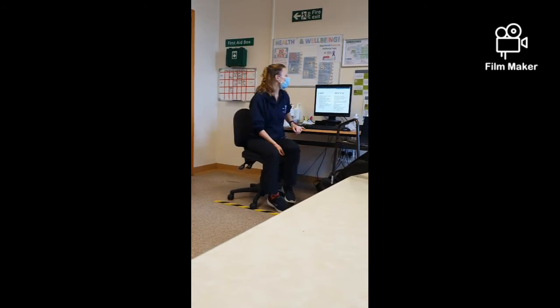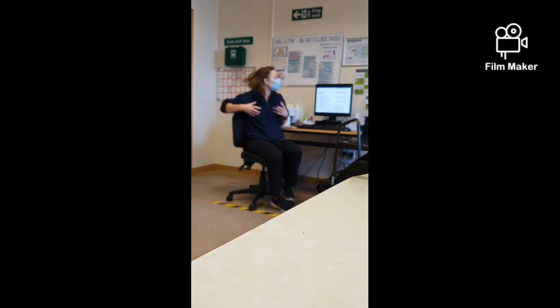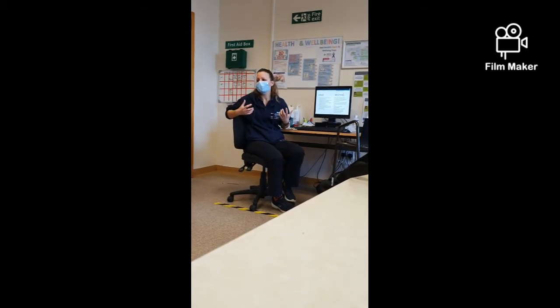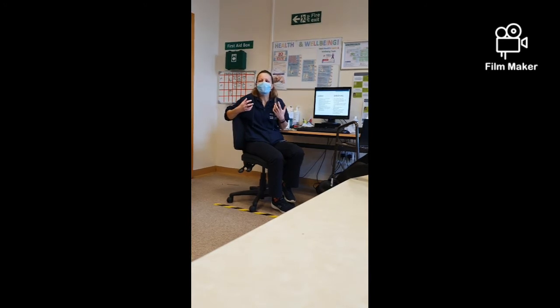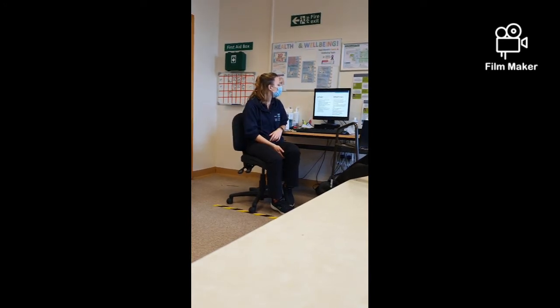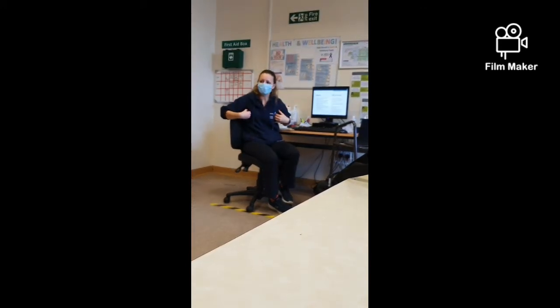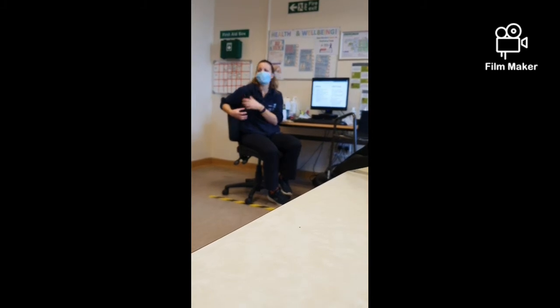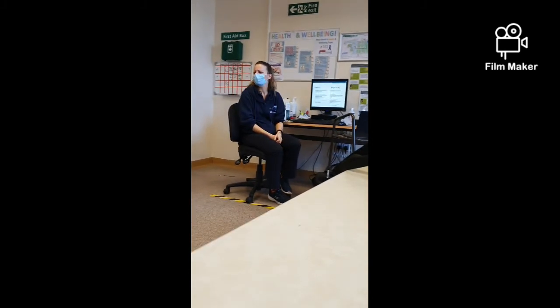Okay. So then your B is your breathing. So we're looking at your lung zones, we're looking at is it normal translucency in the lung field, and is it symmetrical? In theory it should be symmetrical, so if it's not, there's something going on there, so then we need to look a little bit further. And also your lung markings should extend all the way to the edge of your lungs, and this is where it would highlight if there's a pneumothorax or a collapse, because you wouldn't get the lung markings all the way to the edge of the ribs. There would be black space, or consolidation.